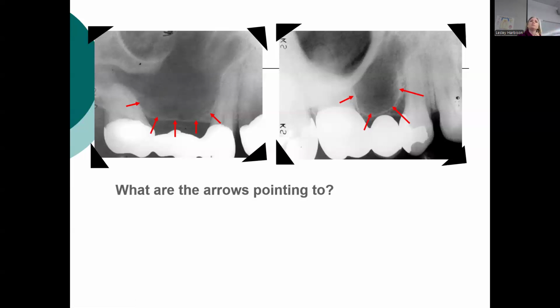Why did you say our teeth are sick? Oh, because the apices of our maxillary molars are pretty close to our sinuses, and for some people it's really close. And so if somebody has a really bad sinus infection, a lot of their teeth can hurt. So sometimes people complain about a toothache, but maybe they have a sinus infection going on, or vice versa.